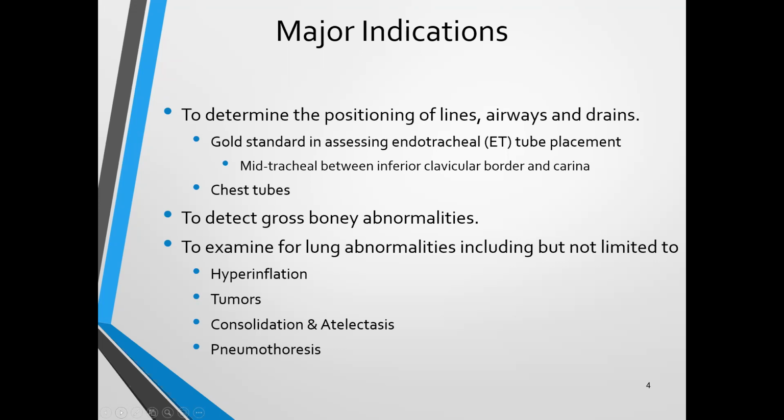And by definition, consolidation means that you don't have airflow. Atelectasis is a related condition, but not the same as consolidation, where you may not have the airway filled with fluid or mucus, but it's just not inflated. If it's in the basilar regions, it could be that the child's in pain. They've had a trauma to their chest, to their ribs. They don't want to take deep breaths, and they develop atelectasis.